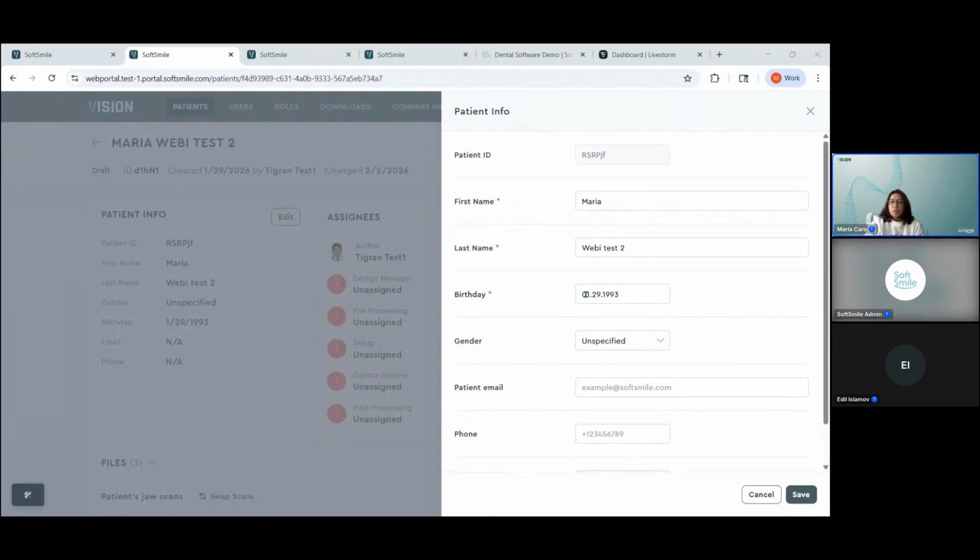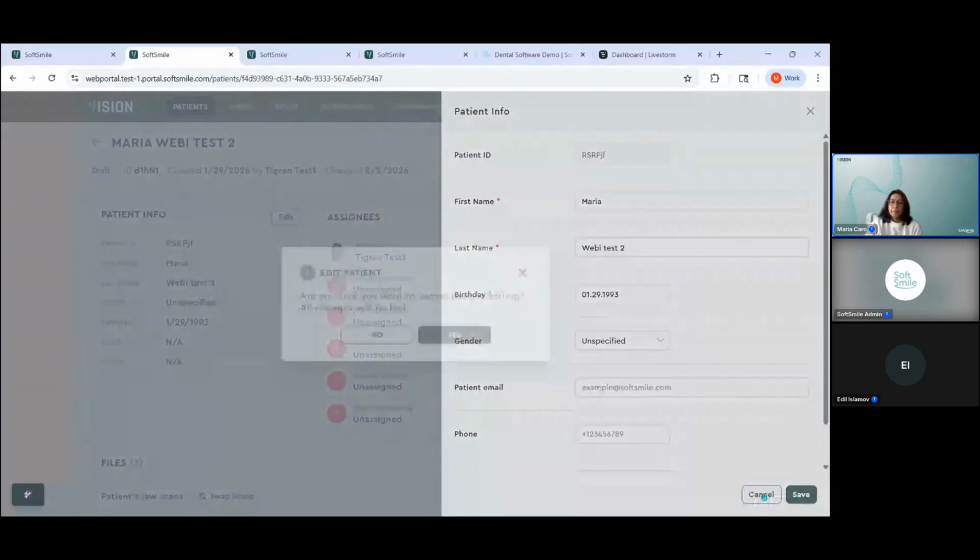information, there's going to be the option to enter the patient's birth date. These are really trying to generate analysis of craniofacial growth. So that's one of the reasons why the birth date is important. So once we've entered the patient's birth date, we save the patient information as normal.